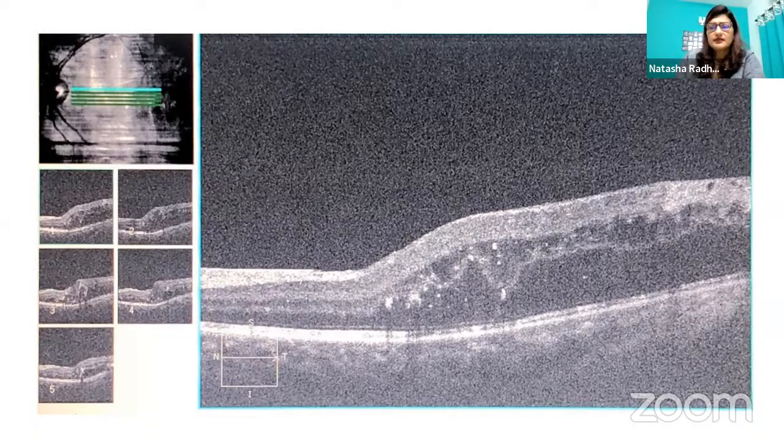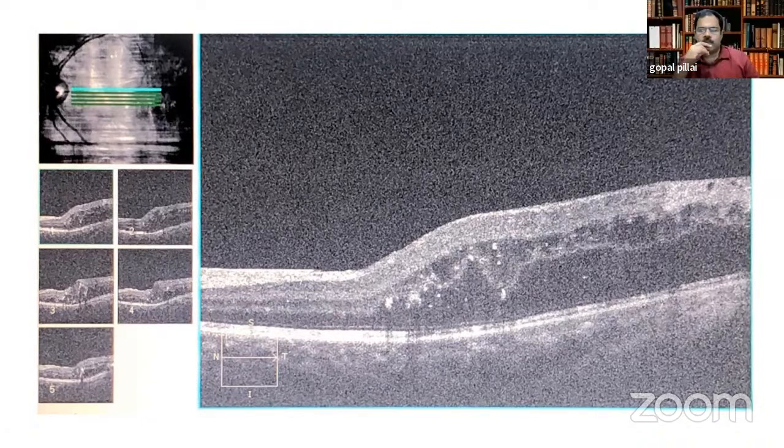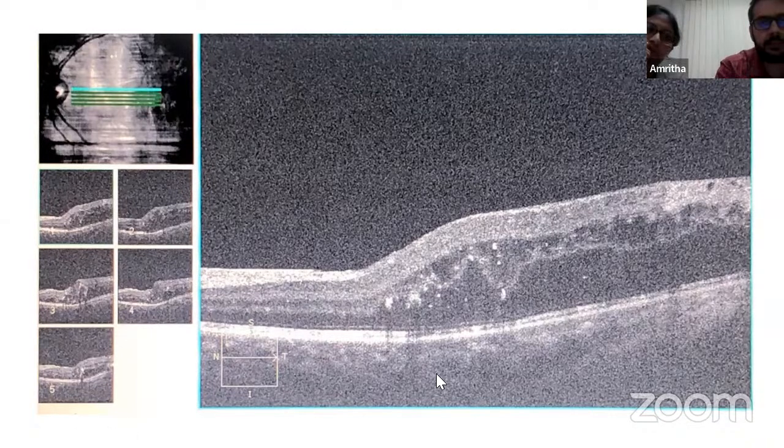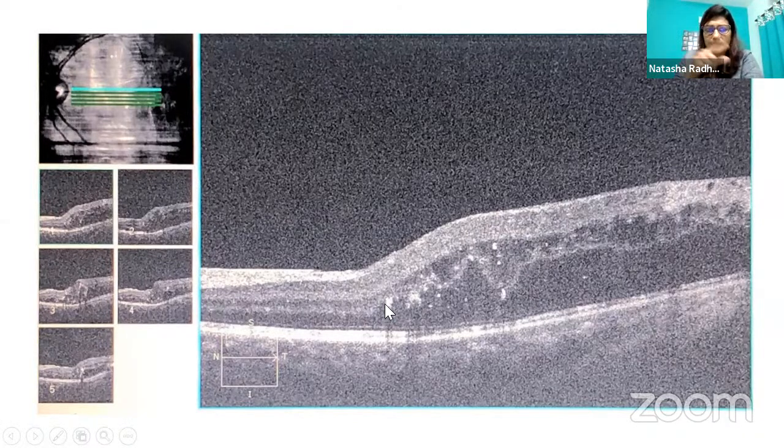Okay, but the OCT is not very clear, and it's showing significant grain, isn't it? You're not able to make out the inner layers clearly. Also, a larger number of hyperreflective foci is a bad prognostic factor. But of course, the image quality is not very good, so we cannot interpret it well. That is because of low signal strength. The graininess is more. Also, that raster is the upper line; it is not the middle line that has been highlighted.